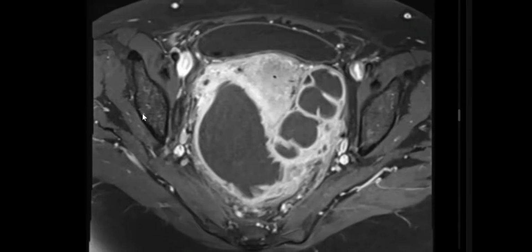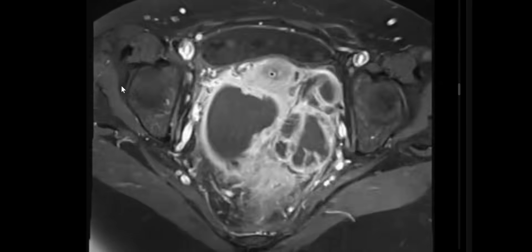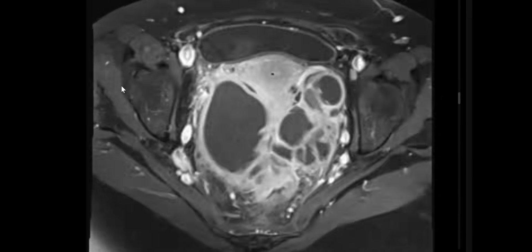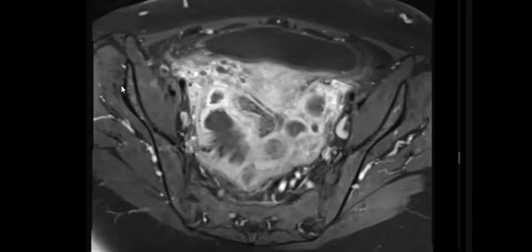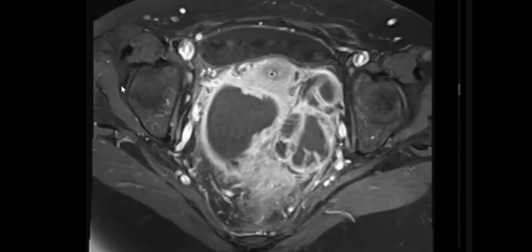Sir, on contrast, this confirms that there are bilateral ovarian abscesses, larger on the right side, with thick peripheral enhancement and a central large area of necrosis. Very good. So this is an emergency and requires drainage and follow-up.